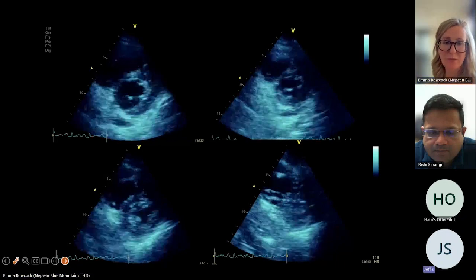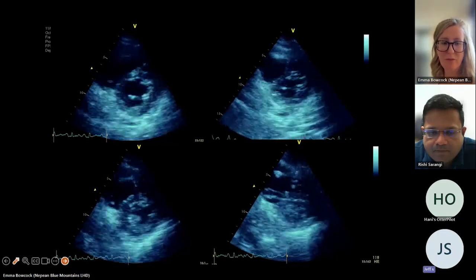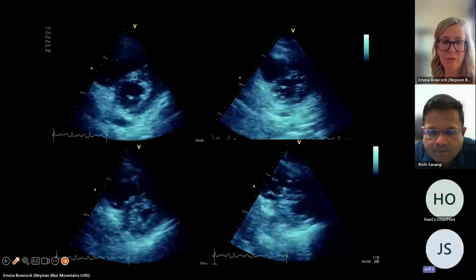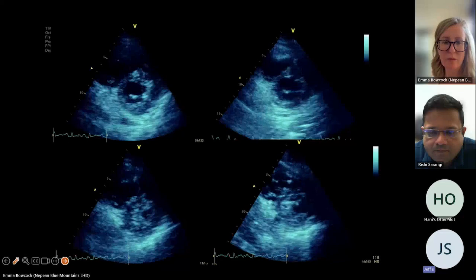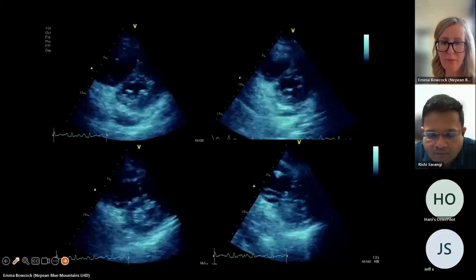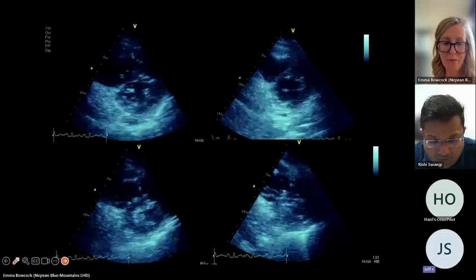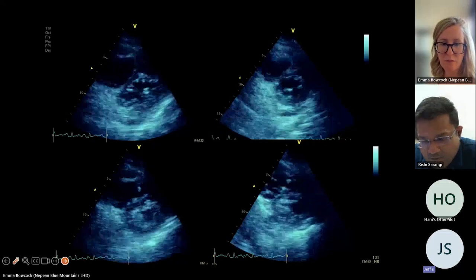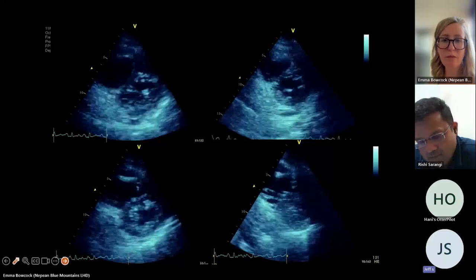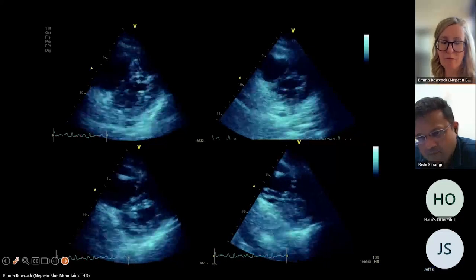Okay, and then clearly pressure overload on the top left with the D'ing out that's pushing back in diastole, at least it looks like. Same for the one below. I can't really make out much more than that. Let me just throw on my phone here. And again, a little pericardial effusion appreciated.